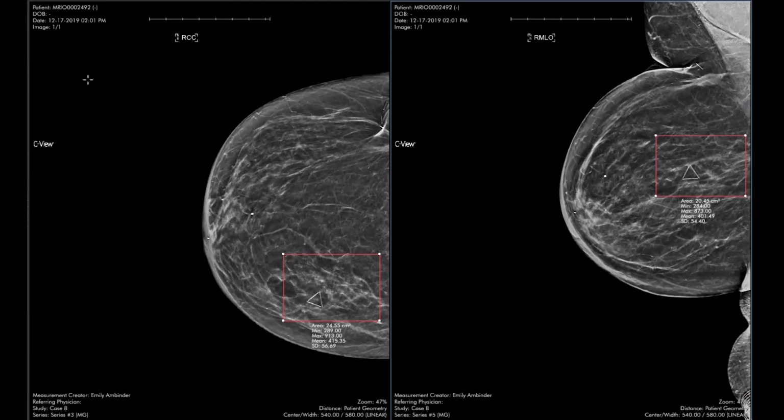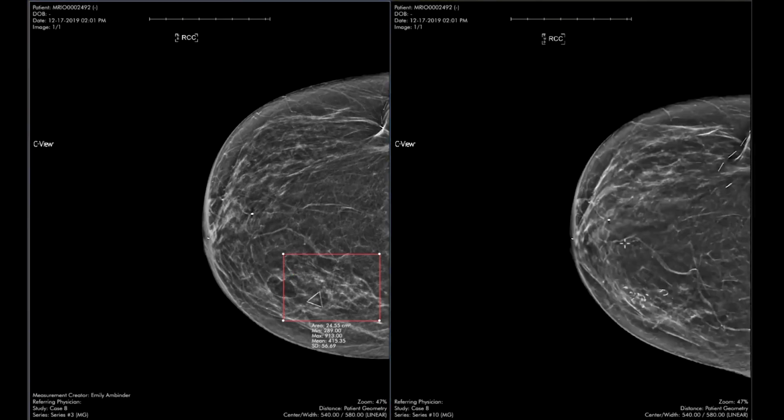So our group typically uses 3 months, and there are several other groups and other expert recommendations to use 3 months to follow up trauma, to give that finding enough time to declare itself. So here's our baseline. This is our exam that we give a BI-RADS 3 to, and this is when they came in 3 months later.